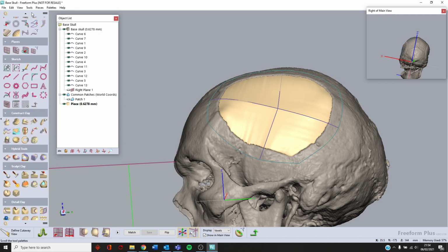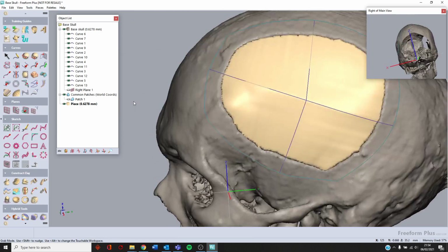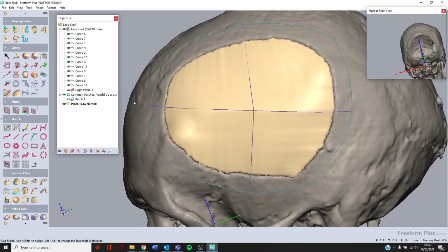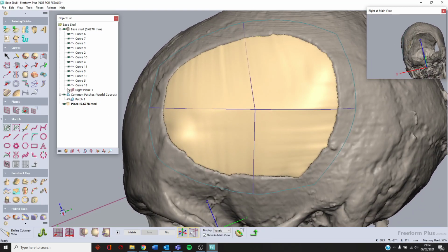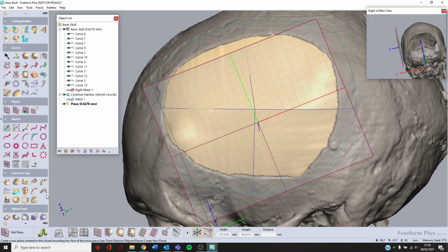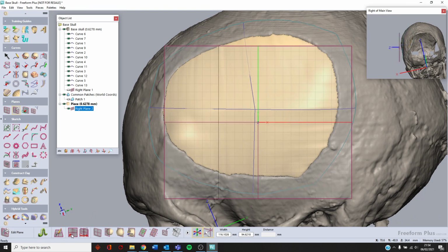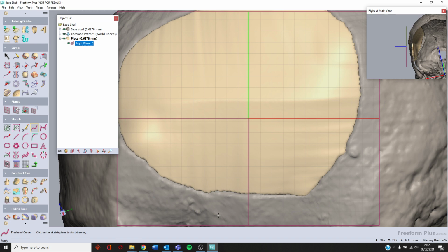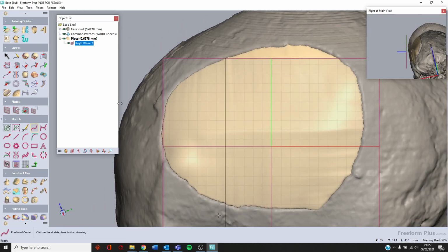and next what I'm going to do, position myself more or less straight above our implant, normal to our implant, create a new plane, make sure that this plane is oriented flat to me. I'll go to sketch on that plane. We can switch those curves off as well, they're only confusing us at this point. Minimize it, that's it, a little bit of housekeeping.